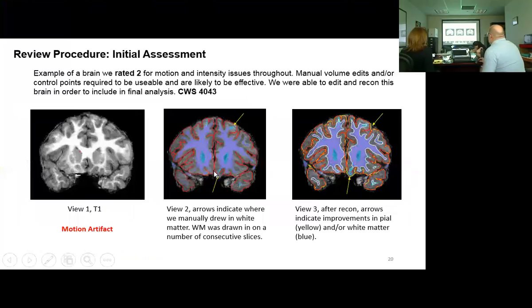So here's that slice where we're looking at the recons here. And actually this one showed, I think this one. No. Is this the same slice? No, it's not. Okay, so this is just showing that if you get something like this, you get a recon here. Is this the original?